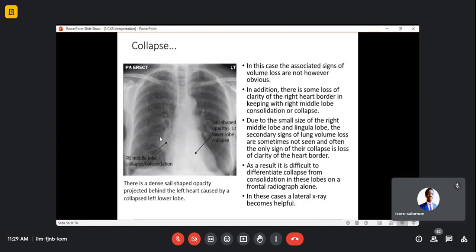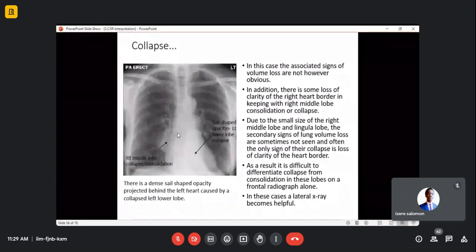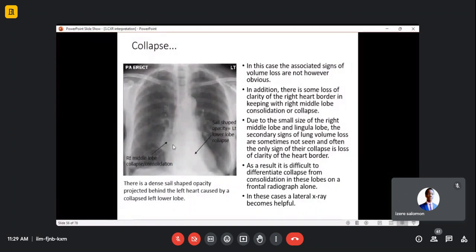Remember I told you, in radiology, you have to know the normal anatomy. Then when it is distorted, it comes out immediately and you search for the answer. Why is it distorted? Look, normally it was supposed to be like this. It goes this way, the border of the heart, but there is an opacity. It's clear. Small, but opacity. And in radiology, there is nothing small. Yes, I saw it. I'm seeing it.